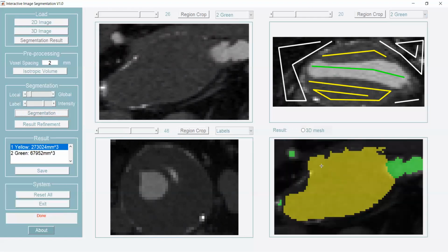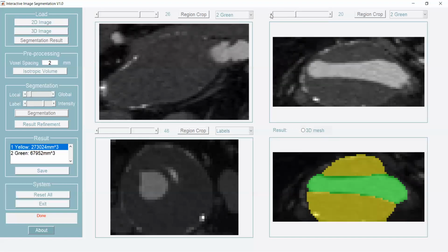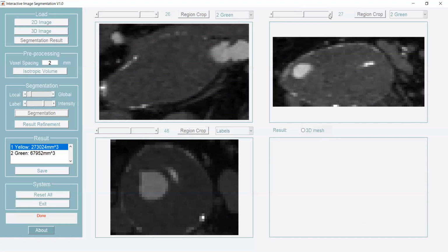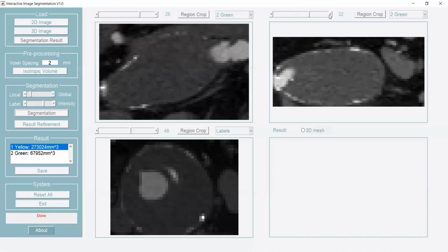as a default, you will see this image display is not this one, because as a default, it will always display the result of the first axis. The image is in the first axis. But if you click the sliding bar, you can see the result of this slice. Anyway, okay. Well, I'm not happy with this slice.